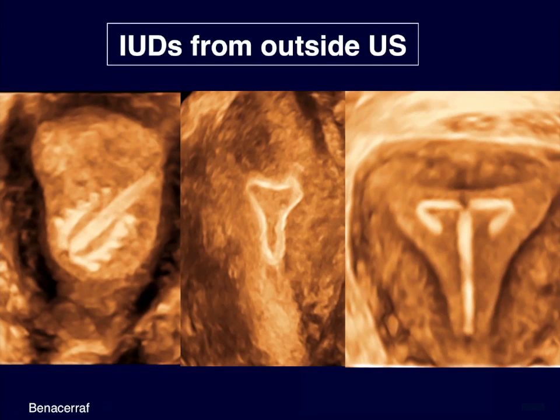Now these are IUDs from other countries, and you can see how they look quite different, and with 3D ultrasound you can delineate how they look and where they are quite easily.